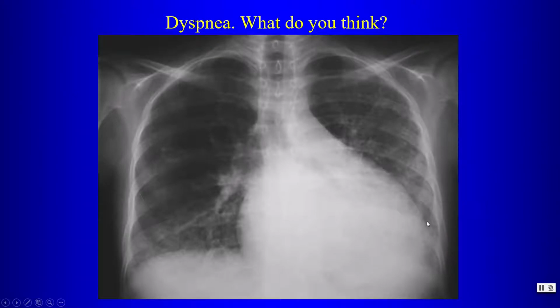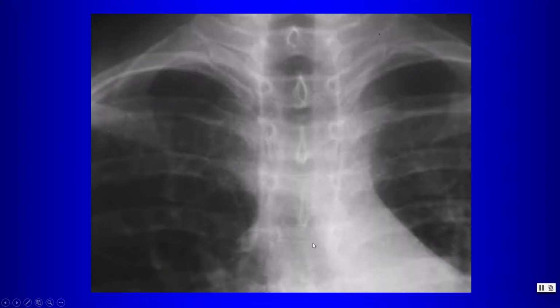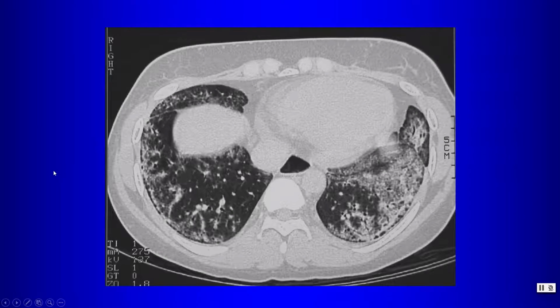I will ask you to ignore the enlarged heart in this case, but if we look very carefully here in the mediastinum, you might see a clue that gives you the diagnosis. I'll give you a second to look at that. Then I'll show you the CT here.